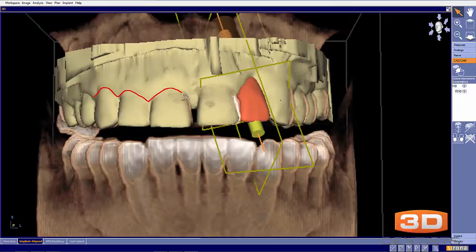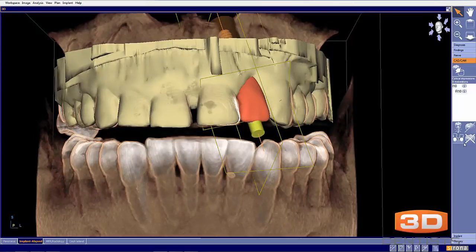Right here, what I'm looking at is, my drawing is not so good today. What I see is the gingival level right here shows a significant discrepancy from canine to canine there, where we can see this lateral incisor right here is lower than that line, and then here it's above that line.